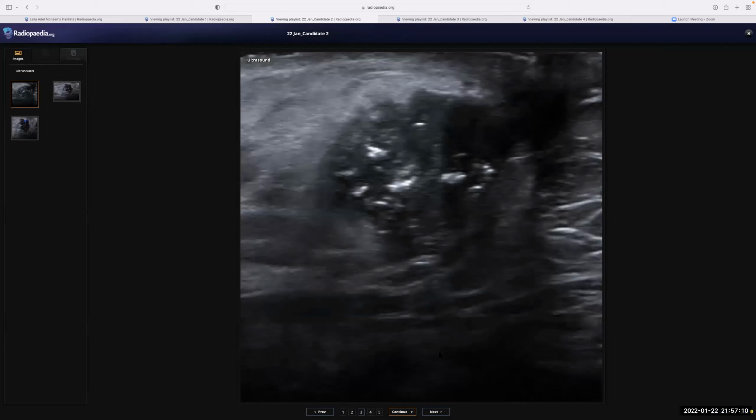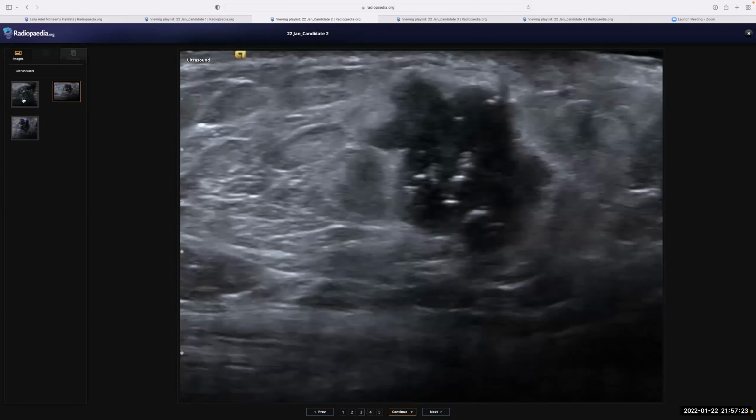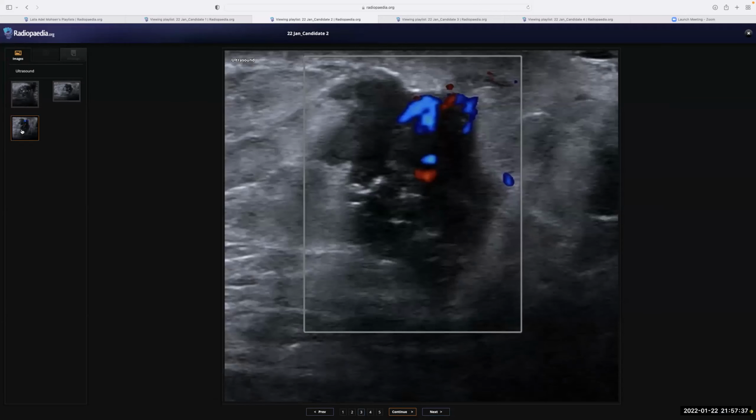So this is a 65-year-old male with a right breast lump. I've been provided with multiple selected images. Although the images are not marked, I believe that this is the right breast, the area of complaint. And what I can see is an irregular, hypoechoic / heterogeneous lesion, which is taller than wide, with multiple calcifications at the site of complaint with vascularity.